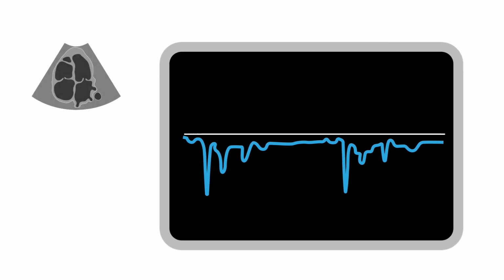Because the right ventricle is at the top of the screen and the right atrium at the bottom when viewing the heart in the 4-chamber apical view, tricuspid regurgitation will be moving away from the right ventricle. This is visually represented on the trace as a peak below the graph line. This means the maximum velocity of any regurgitation jet is the furthest measured point below this axis.